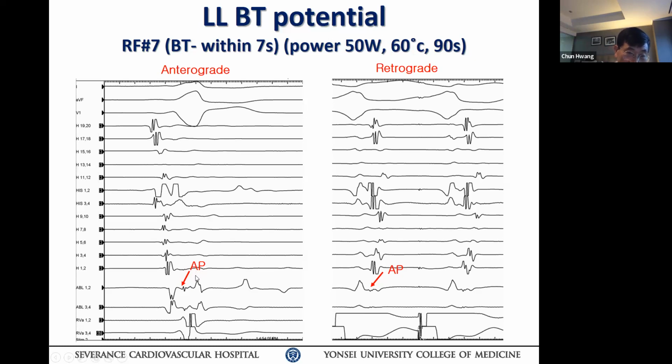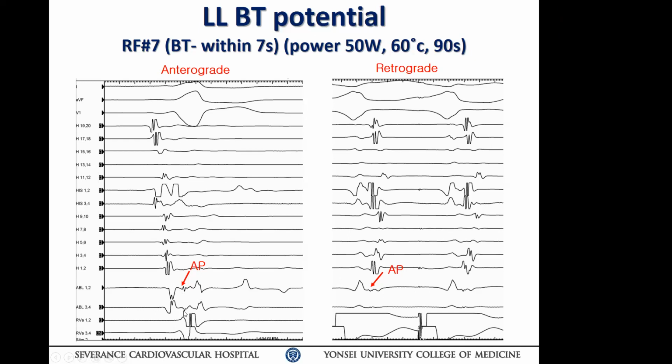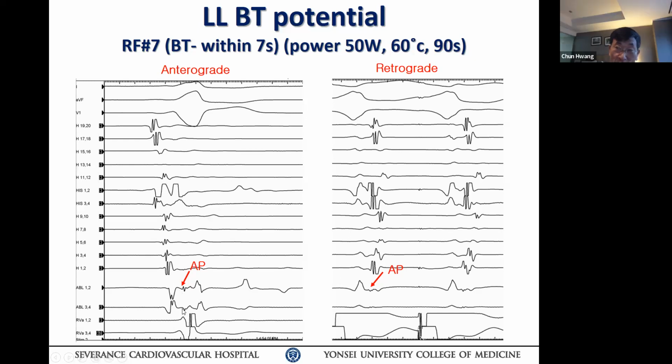The signal that you're looking at is a far field, first of all. That's a far field. Your near field is the QRS complex on the ablation catheter. You see that P wave, high frequency, sharp. That's a near field signal. Next is the potential you're describing to me. That's far field. Look at the proximal, how broad it is. The electrode 3, 4. Yes, you see? It's a far field signal. So I'm not sure what you're looking at.